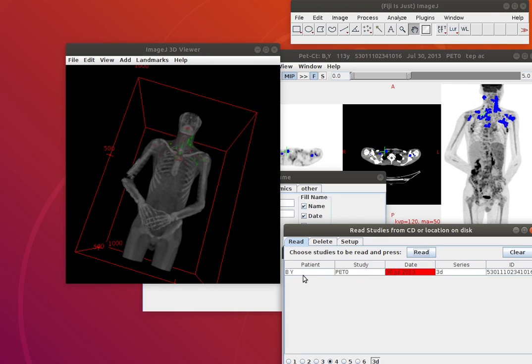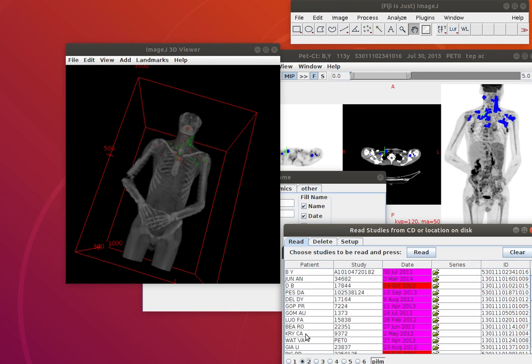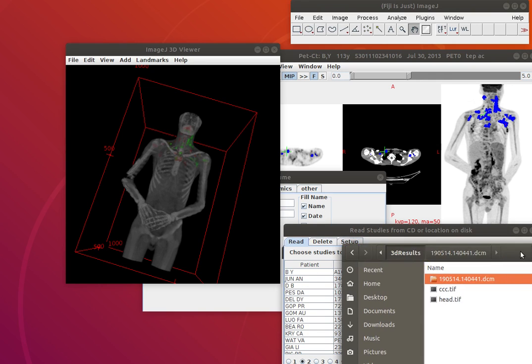And I see it in a more intelligent format. You've got the patient name, the study name, the series name, the ID, and the date. Everything you need. In theory, you could embed this in the original position here, but that's fairly complicated. It's much easier just to take this and send it to the PACS. Let the PACS worry about it.